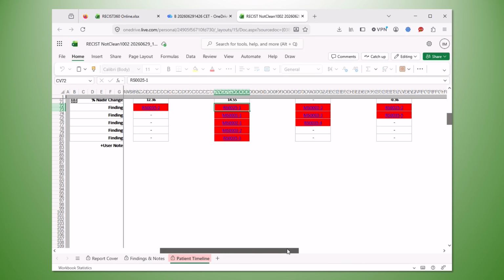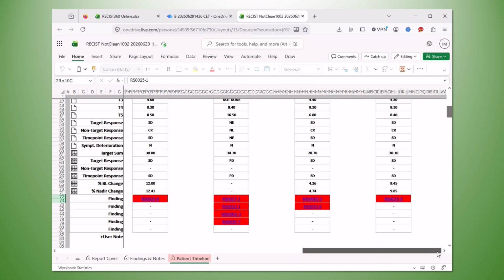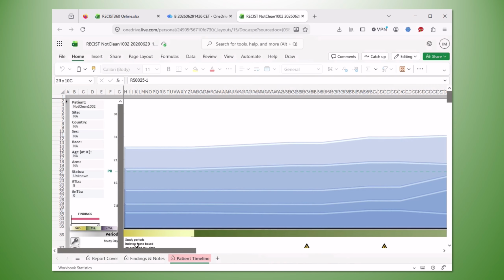While this was a demonstration of how to use the online facility, I hope from it you can understand how the RECIST360 team has the capacity to automatically scan all of your RECIST data for errors. Why take a chance without a pre-locked QC? Try it now.